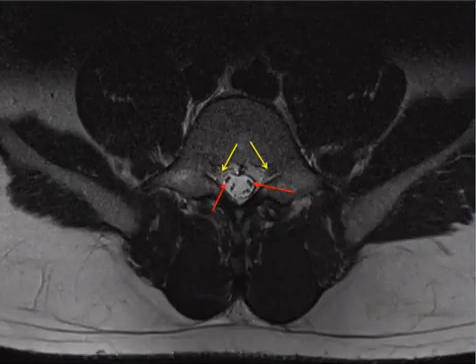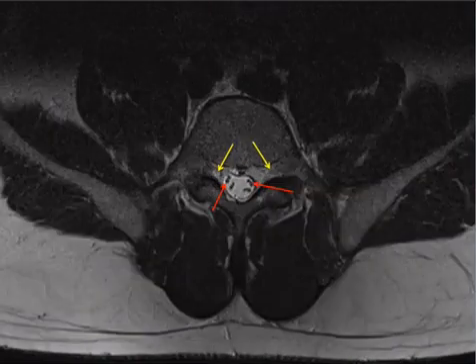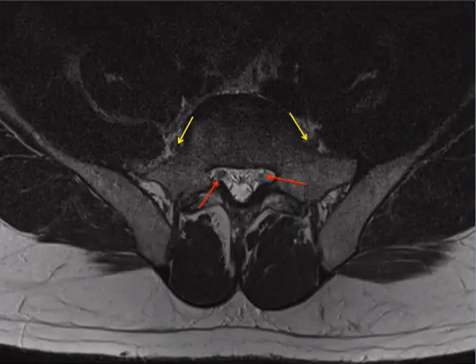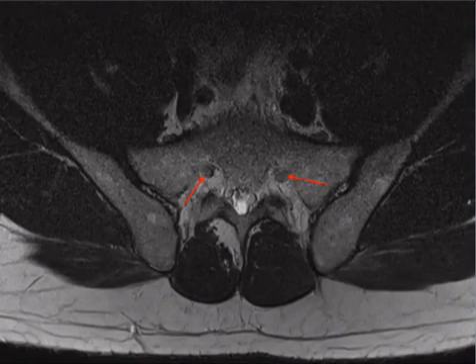So just watch as I scroll down here and see these yellow ones are on the way out, on the way out, on the way out. And then the red ones are going down. Now it's their turn. They're going to start to go out. So next level.